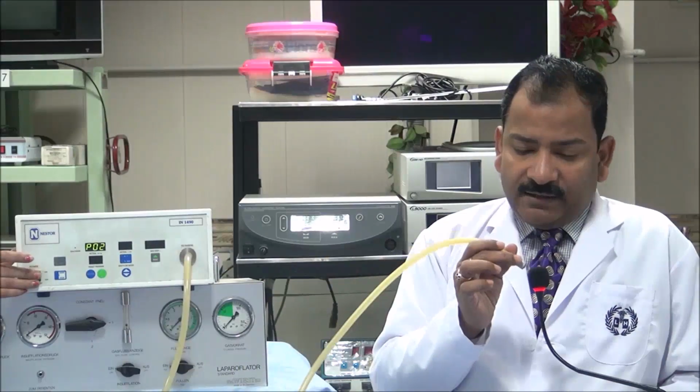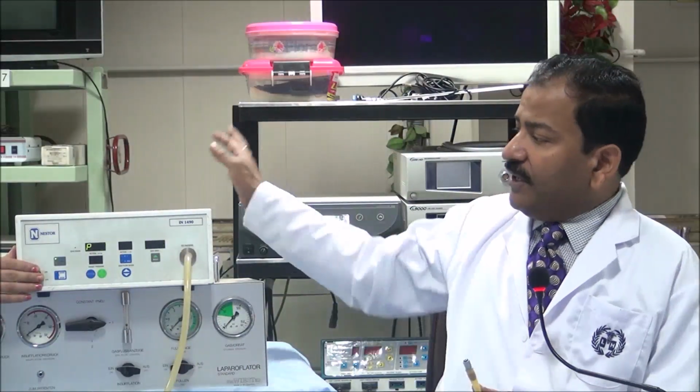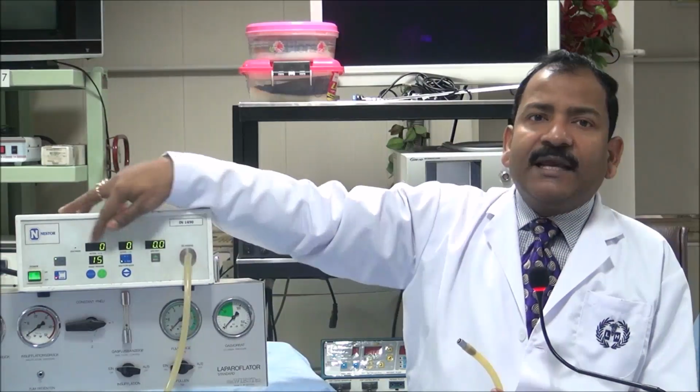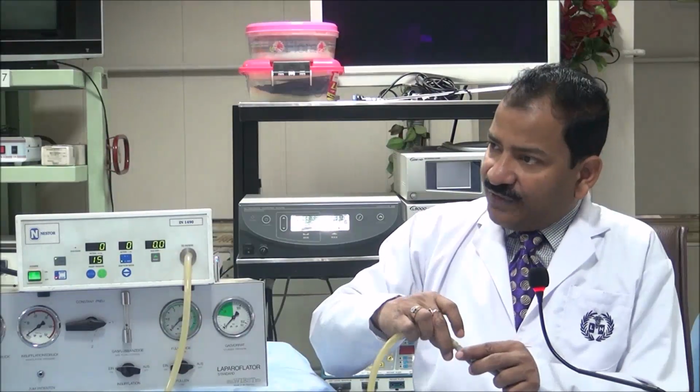So what you have to do: switch off again, disconnect it and switch it on now. And you will see the air coming, and all the air is flushed out. The amount of air from here up to there is 800 ml, and this 800 ml is discharged. Now up to the tip of this tubing, what is there? CO2. And now there is no error and it came to the standby position. Now it is ready for flow to start.